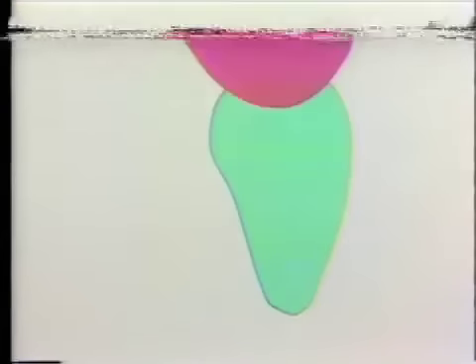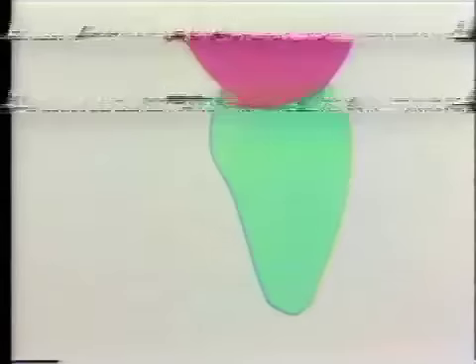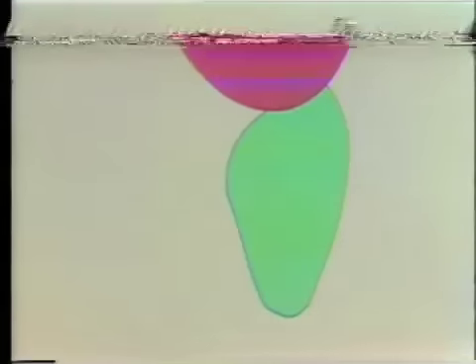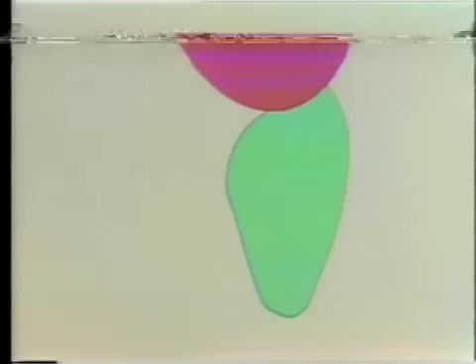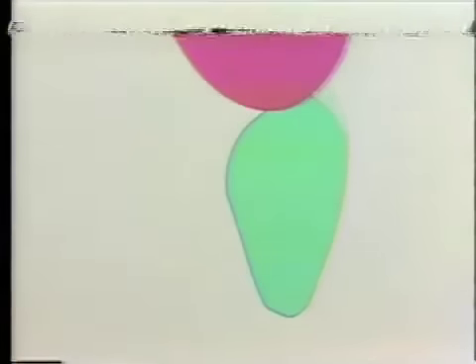The lingual surface of this natural tooth form is modified, as you see in the diagram here. It's swung in on the lingual surface to meet the new position of the alveolar crest at its highest point in there. This modification of the lingual surface here also, of course, opens the lingual embrasure, and it helps open the proximal embrasures, as you'll see in later diagrams. Now, modification is necessary, of course, on that labial surface, because at the present time it would be too long.